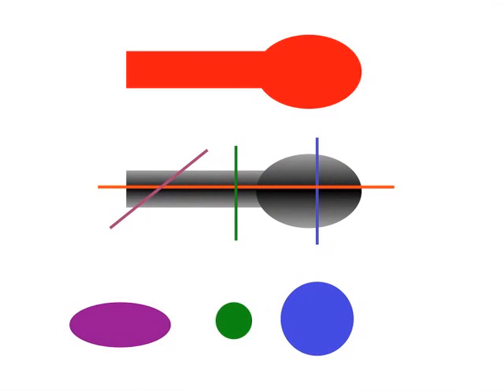Now, here's your pseudopod, okay? When you see it on the horizontal plane, easy to identify. For a pathologist to get this image, it means that all the stars have to be aligned in the universe. Normally you do a vertical section, you cut it through there, you get a round globular structure, or a smaller globular structure, or a little bit of an oval structure. And only if the section occurred smack through a pseudopod would you actually be able to see it histologically. And so that's why on the histology end, it's not as important as it is on the clinical end.